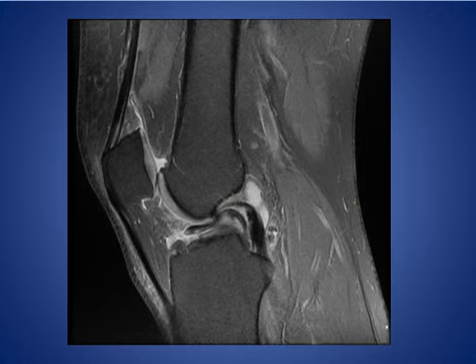Here, this is the sagittal fat-sat MRI. As we see here, the posterior cruciate ligament, and here looks like another posterior cruciate ligament, and we call this sign the double posterior cruciate ligament sign in knee patient, and this is a classic sign of bucket handle tear of the meniscus, and it involved about 80% of the medial meniscus.